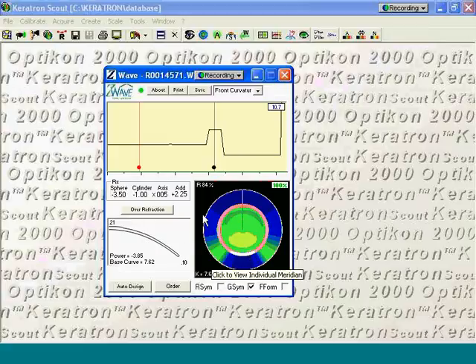As you can see when we look at the bottom half of the lens, it's thicker than it is at the top once again. This lens doesn't have any astigmatism correction on the front surface, but it does have this bifocal design with a very small pupil size, and that's what creates the need for the prism ballast and the increase in thickness. So keep in mind, whenever you use a very small pupil size, or whenever you have an astigmatic over-refraction, you'll have a greater thickness to your contact lens design.